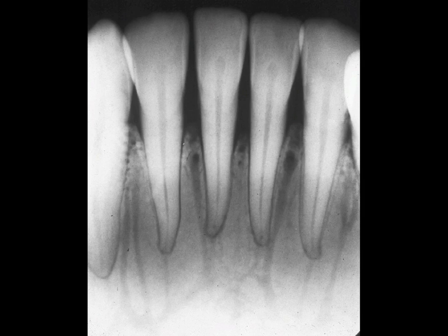Okay, this is a periapical radiograph of the lower anterior region in a patient. When you look at this, I expect you're thinking it looks very odd. The bone looks extremely radiopaque, and we can see numerous radiolucent lines within the bone, particularly going up between the roots of the teeth. Well, this patient does have unusually dense bone, and this may be due to a bone disease or as a consequence of periodontal disease, or just normal variation.